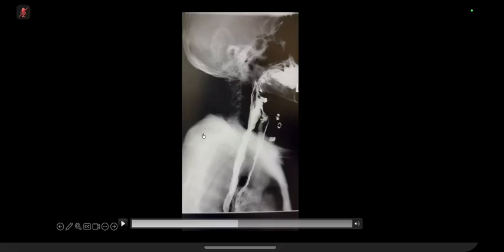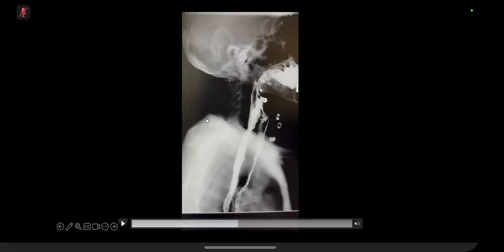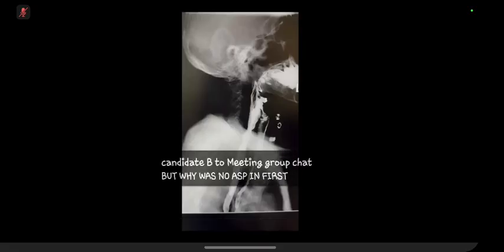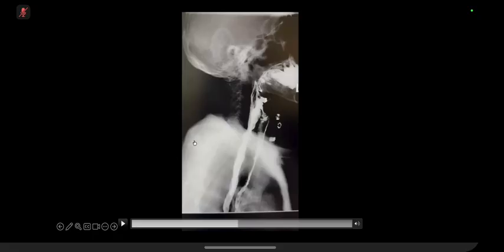This patient had a brainstem stroke in the past, and he presented that he's feeling that something is not swallowing right, like dysphagia. But this is what we observed on the post-operative films, that he's having a lot of aspiration. Because of that, we went back and checked the history, and he had a stroke, and he had a similar presentation before as well, with a lot of aspiration and aspiration pneumonias. So this can be one of the causes in this scenario as well.